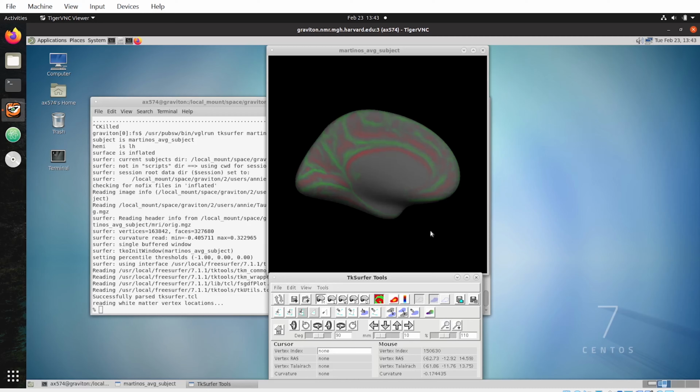So we're going to be focusing on the medial surface because we're going to cut out this gray medial wall, and we're also going to introduce 5 relaxation cuts. One here, one about here, one about here, one about here, and then one from the tip of the temporal pole back up to the medial wall area. Usually I like to start with the medial wall since that serves as a good anchoring point.